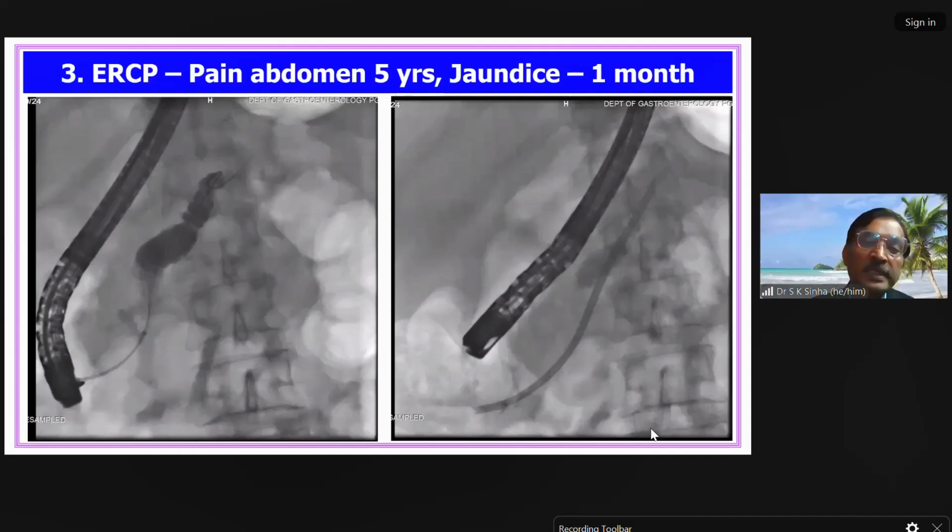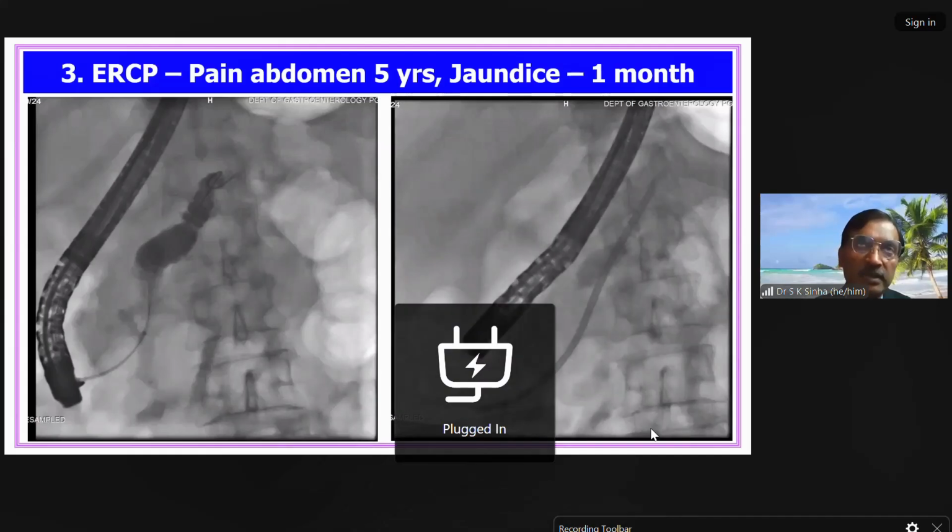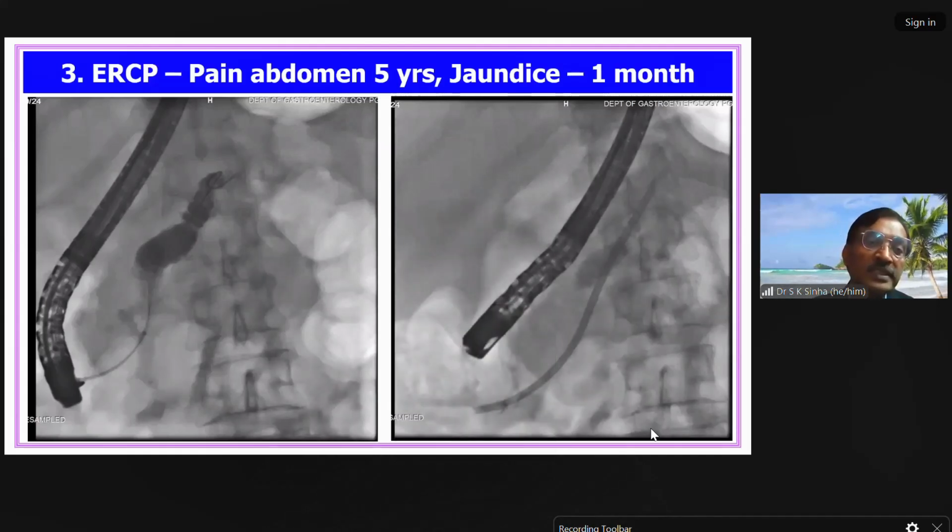The pancreatic duct branching is always at right angle, in contrast to the bile duct branching, which is always acute angle branching. So you see clubbing of those side branches, then equivocal up to 3, more than 3 is taken as mild. If changes start in the main duct, but no dominant stricture, then it is moderate changes. And if you have multiple strictures, chain of lakes appearance, calculi in the main duct, then severe changes.